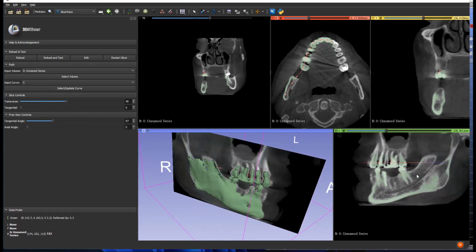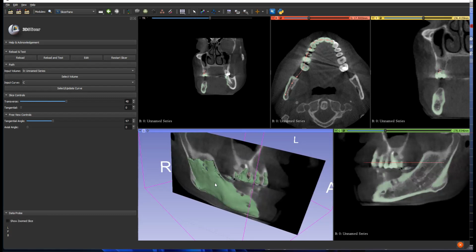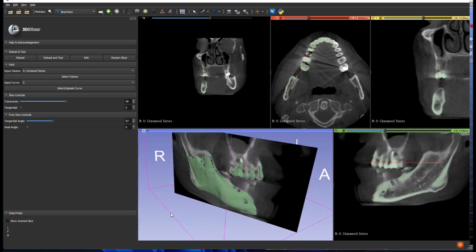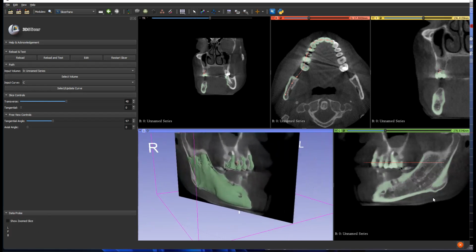So that takes a bit of practice, I'll be honest. When I first started, it was an impossible mission to find it. But, with a bit of practice and knowing how to rotate these, it's actually quite easy to do.